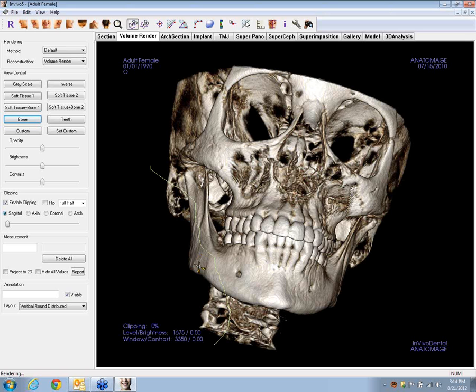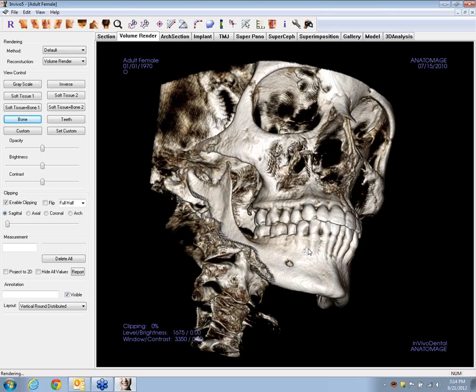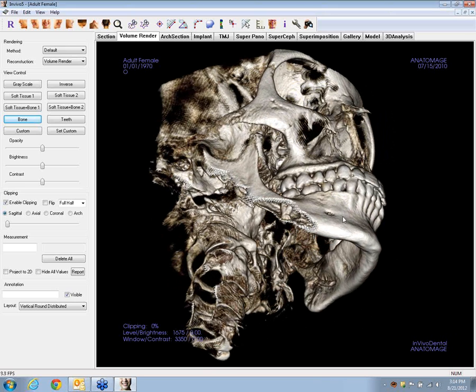So I'm going to go on this side of the line that I've just described, and we'll use a scissors tool, and you can see that I just cut perfectly parallel to the line that I drew. We've created a plane that goes straight back in space, and so all of the tissue that is in the way has been cut out along that plane. So you can see I've made a pretty good cutaway of my mandible, and you can see what's inside there, the roots of that molar. You can see the cutaway section of my spine.